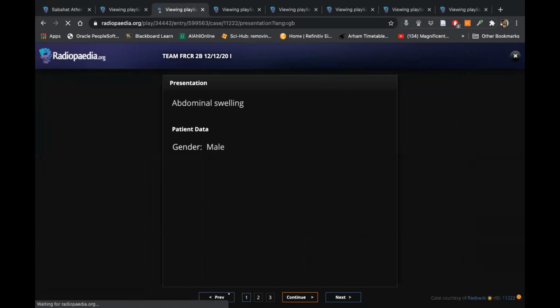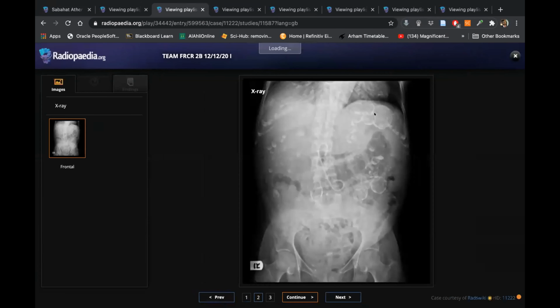Let us carry on. This was a very tough case in the sense that this is plain, but you did well. One thing which I would say, although Radiopaedia has called it a biliary stent and saying that this is biliary gas, but somehow or other I cannot convince myself. It seems like a DJ or some misplaced sort of thing. Misplaced stent. Yeah. But let's leave it at that. Let's forget that this is here.